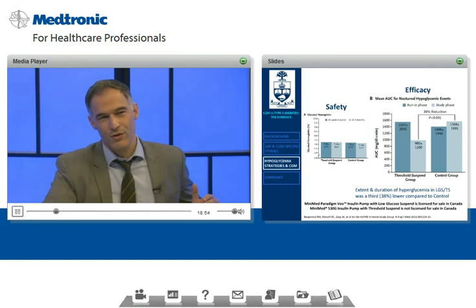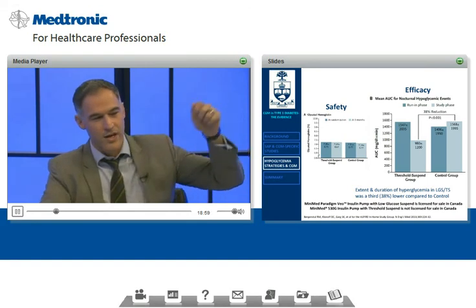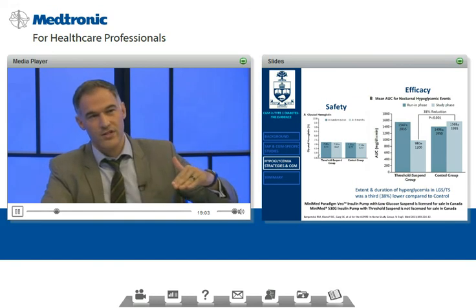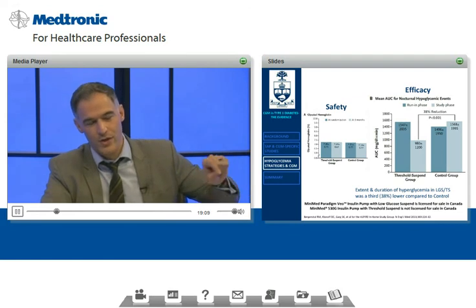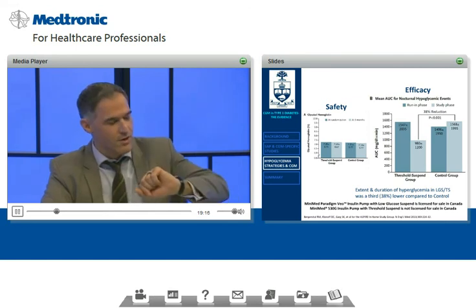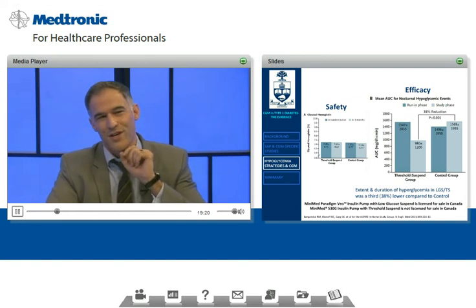So remember, area under the curve, you can picture a CGM output. It's as if you drew a flat line at the 10 line, or here, in this case, for hypoglycemia, at the 3.9 line, and you're measuring the area between the curve and that threshold line of 3.9. Let me just describe this for one moment, since I think I'm doing well for time.